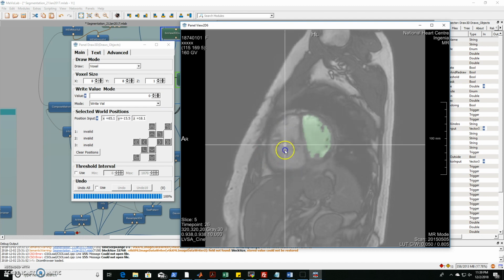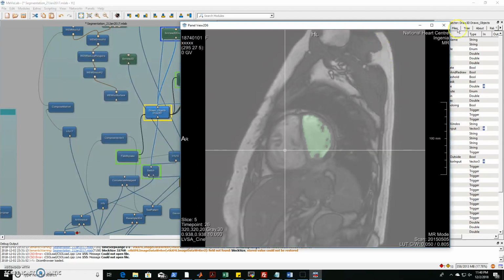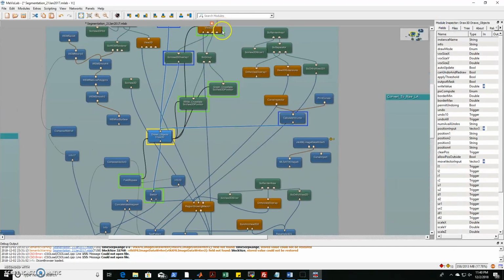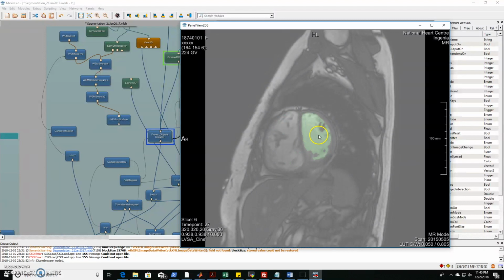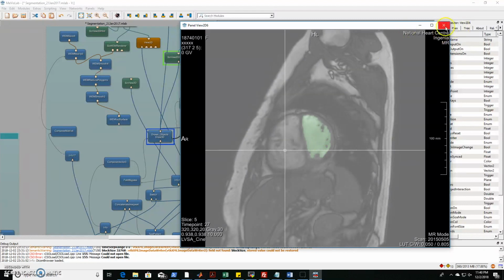It takes a little time and a little mouse skill, but once you have all that done, that's definitely the longest part, so that's a hurdle that you get over. Within here, it's okay just to exit out. If I exit out of this and then open it back up, it's going to put me right back in the same spot with the exact stuff I did. So you can just exit right out.